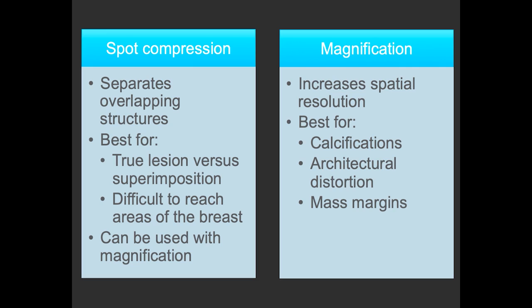magnification view. Magnification predominantly works by increasing spatial resolution of the finding, and this is best for calcifications, architectural distortion, and mass margins.